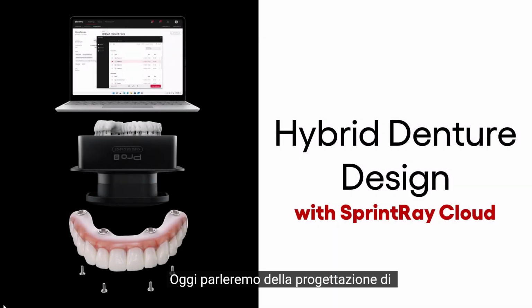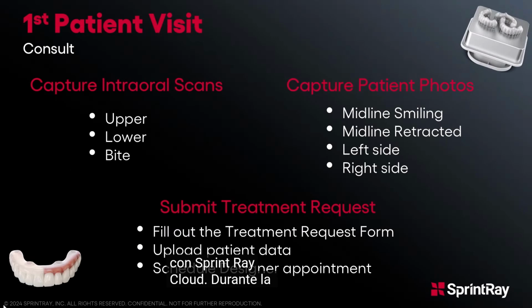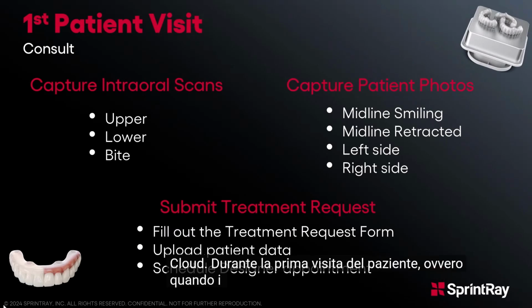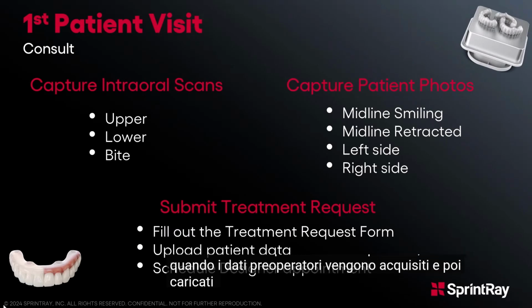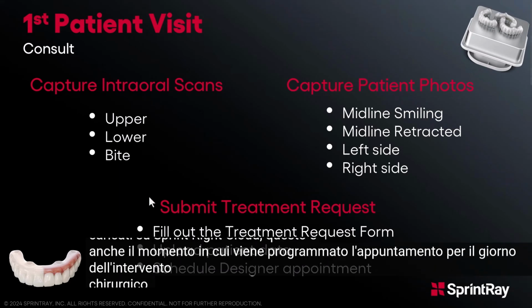Today, we will be covering hybrid denture design with SprintRay Cloud. During the first patient visit is when the pre-op data is acquired and then uploaded to SprintRay Cloud. This is also when the appointment for the day of surgery is scheduled.